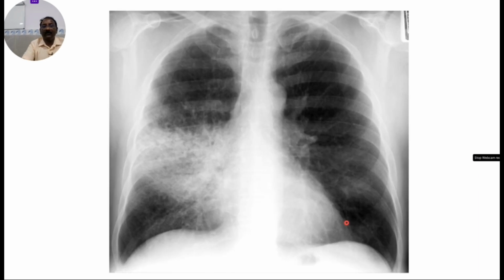See here. Okay. So which pathology here? Right middle lobe pathology. Are you able to see the right border here? So it is obscuring the right border here. This is a silhouette sign. You are appreciating the left border, not the right border.